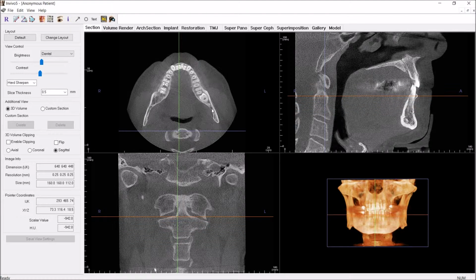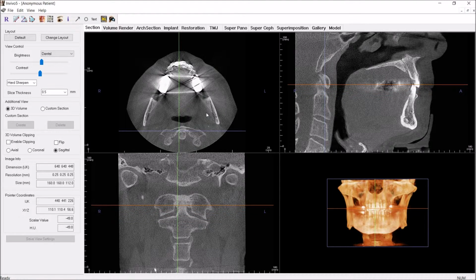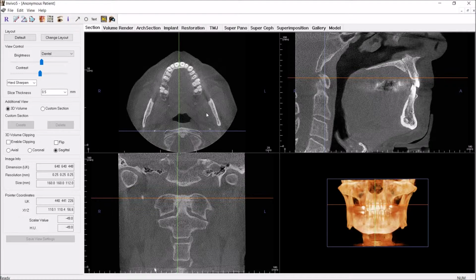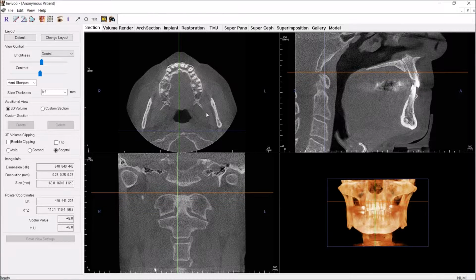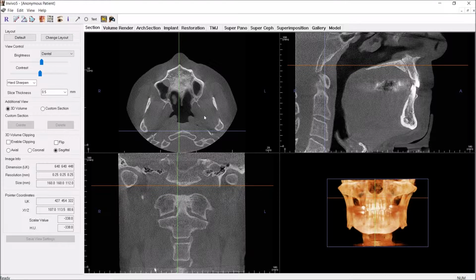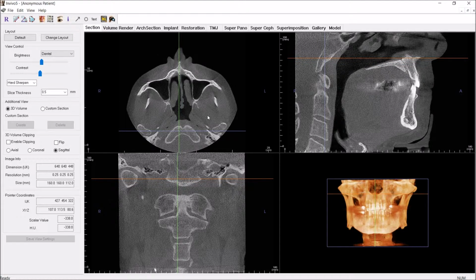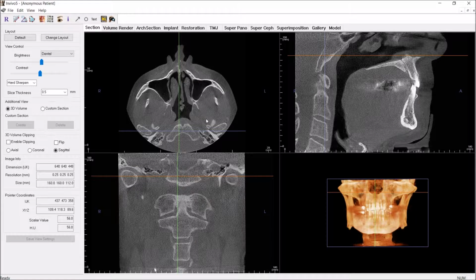Nothing else is really standing out so far. So here we're going to get to the base of the skull, and I can talk more about the foramina of the base of the skull. Some people don't like to hear about it. They think you're just showing off when you start talking about anatomy, but if you don't know the anatomy and you're not accounting for each of the foramina, what business do you have interpreting this image where you're held liable for everything that can be captured in the field of view? That's my opinion, at least.